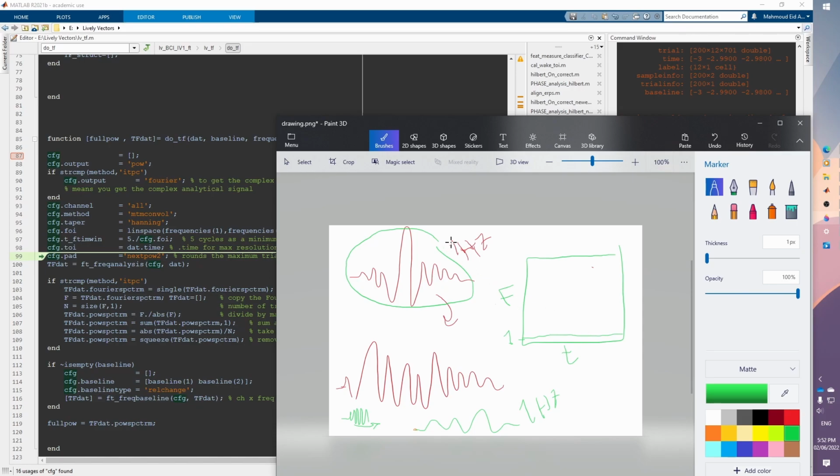And the thing is, you can just now change your wavelet to 2 Hertz, and you estimate the second frequency and put the second row, and so on until you finish all frequencies, and then you will have your full time frequency plot.